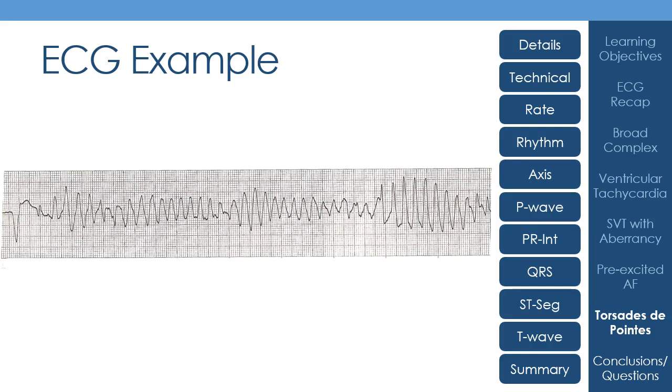And that's because it's this signal just rotating around the ventricle, round and round. And so unlike the ventricular tachycardia, either coming from that small reentrant circuit or from that area of automaticity, which are firing off from the same place each time, therefore the QRS complexes look the same each time, with the exception of fusion and capture beats, here it's changing the whole time because it's just rotating around the ventricle. So that's one thing to say.